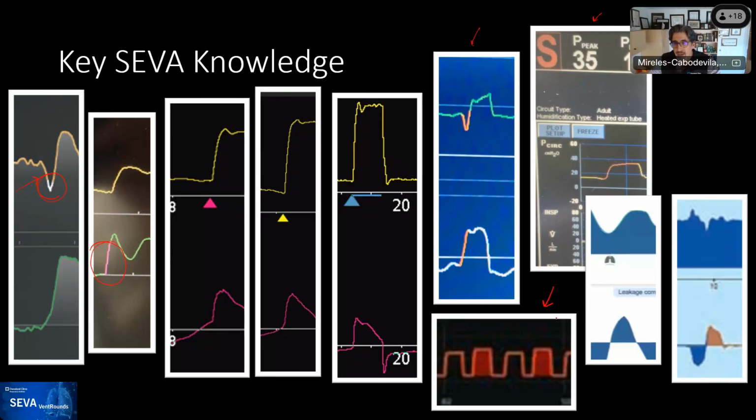Down here, it's another ventilator, and yeah, this is the Bella Vista, and the Bella Vista does something more tricky. So when it's a mandatory breath, it leaves it hollow, and when it's patient triggered, it shadows it. So spontaneous, it shadows it. So you see it's a mandatory, spontaneous, mandatory, spontaneous.